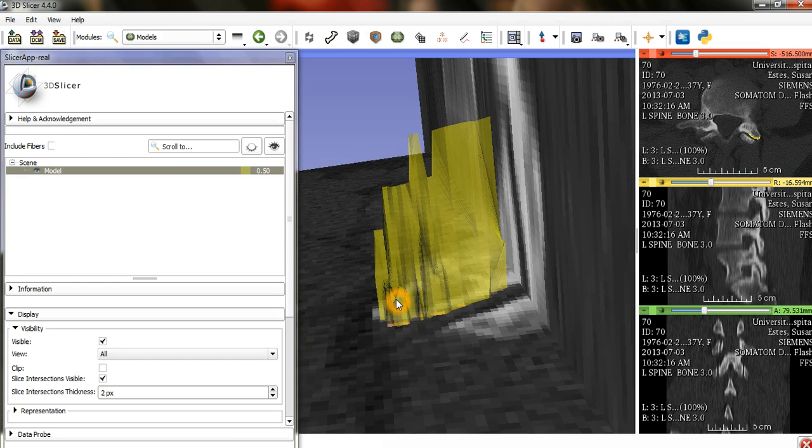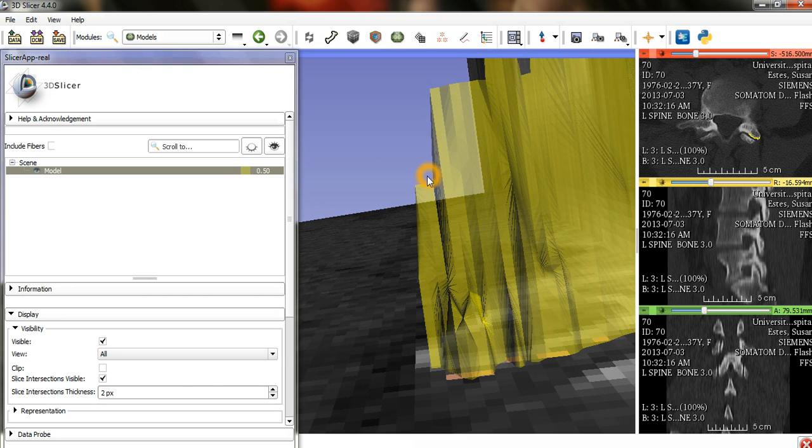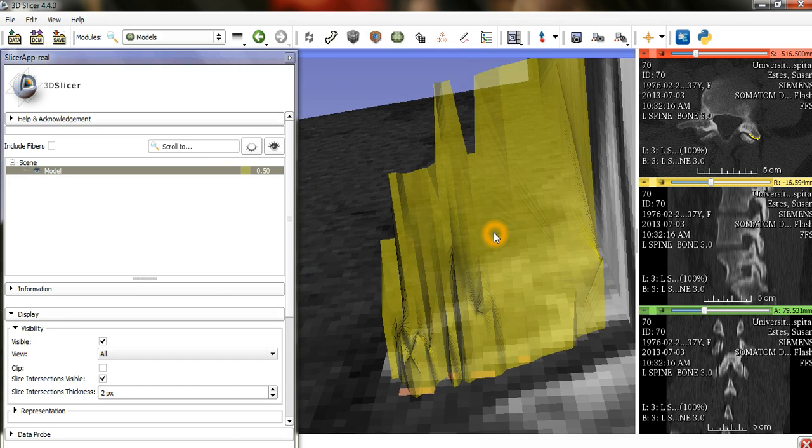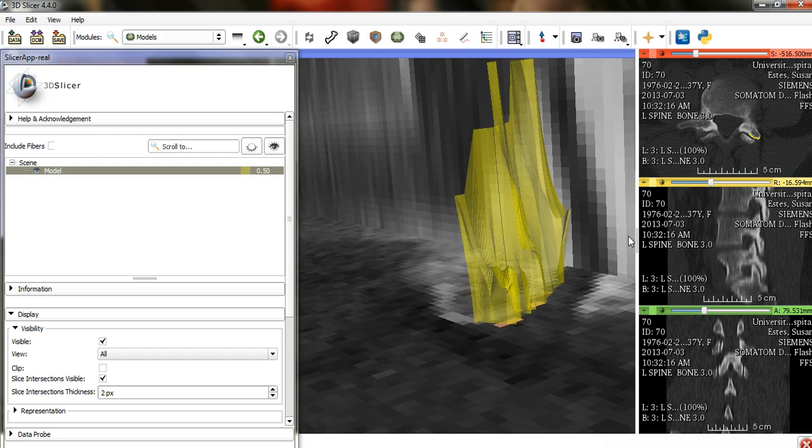It's a little bit choppy, I suppose. You can see these edges here. I'm going to try in the future to kind of round these a bit more, but as of right now, that's kind of where it's at. So here's where it's at.